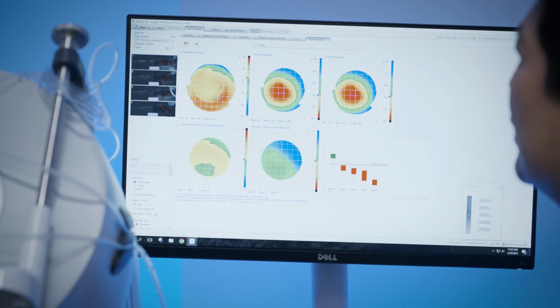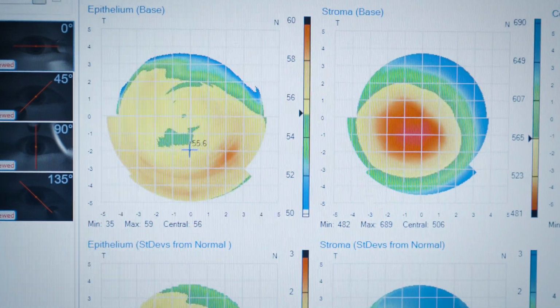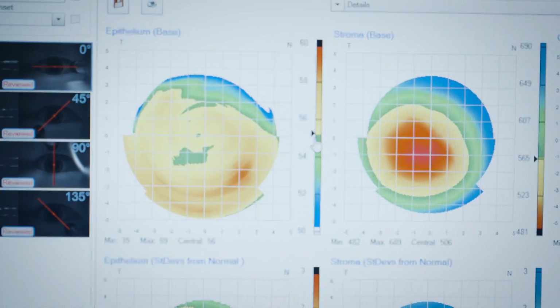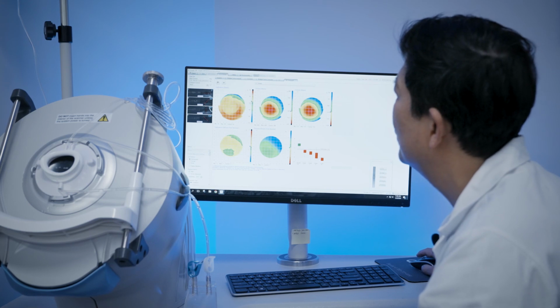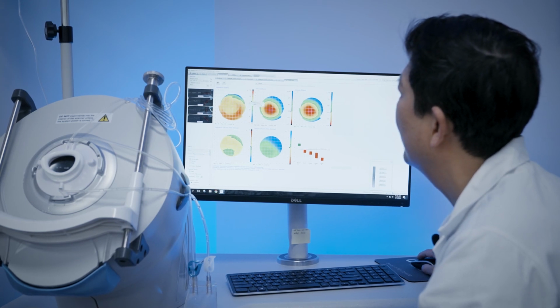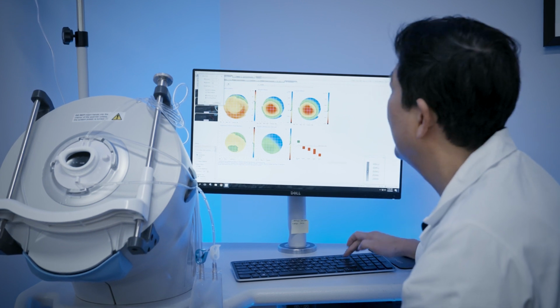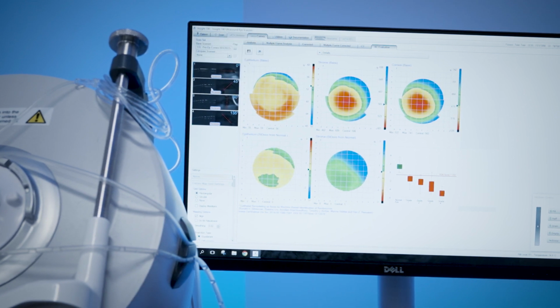But we want to get as much power in there and zoom to optimize the use of the scale. So up here is not something that we're concerned about. So we don't really need 40 and even 60. So you can click on the black arrow and go to adjust scale. And we'll just put in a number here. I think more like 50. And then we can keep it at 60 and then just put OK.